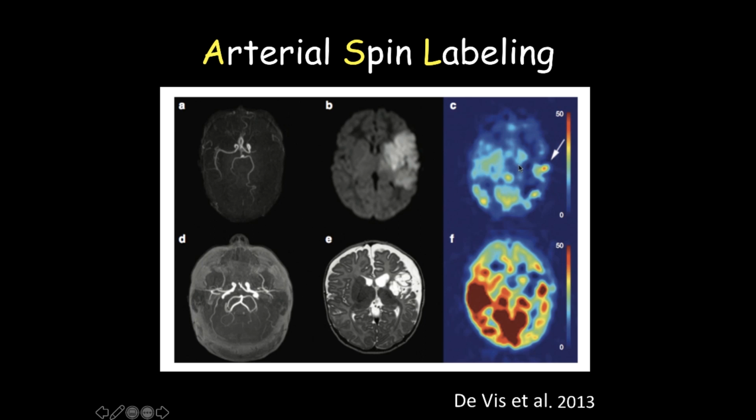In the last image, this is an ASL, I can't really see a great perfusion of that area, but I can see a focal area of red color. This is called arterial transit artifact. This is an artifact related to the slow flow or related to a closed area of parenchyma suffering due to ischemia.